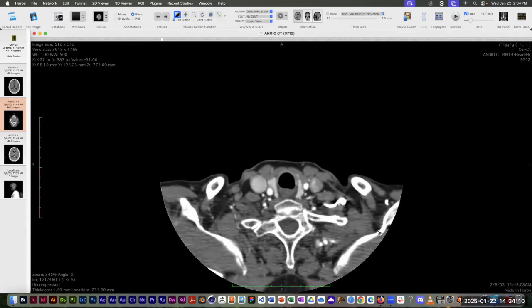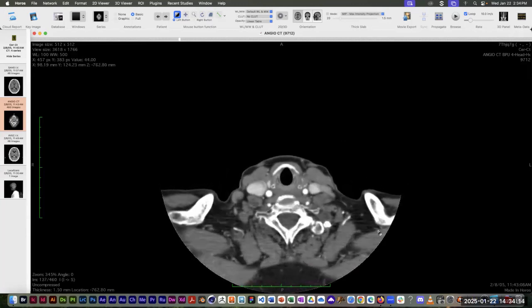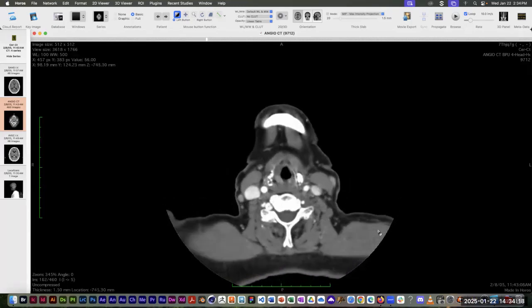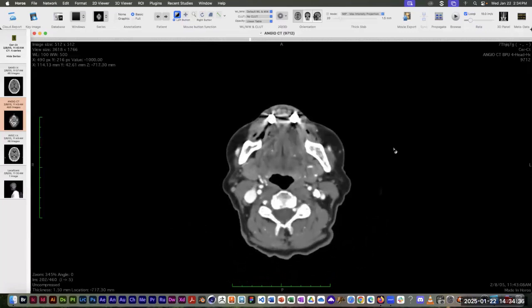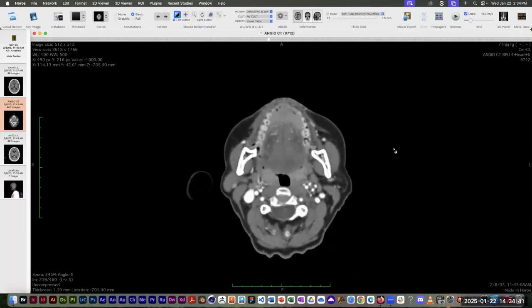That's probably the T1 vertebra right there. Now we're getting up into the cervical vertebrae, into the neck. You can see here's the mandible starting to come into view, his chin up at the top of the image. You can see the trachea, still a nice black triangular structure. A couple of teeth. So now here's the upper teeth.